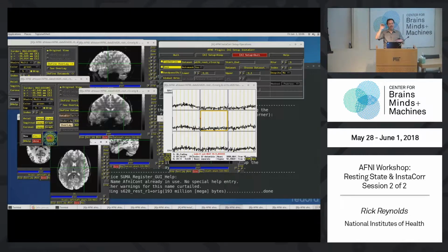And then aligning the EPI to the NAT, well, it's just going to stick one blob over the other blob and say we're done. If you want the nice cortical contours being followed in the registration, you need some contrast in the data. So you care about that.